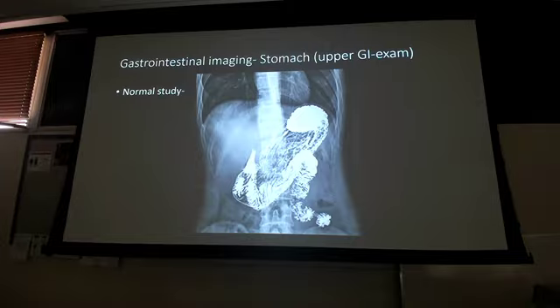But if you think about the way the stomach sits, these patients are lying supine, and the stomach kind of sits back, so the fundus is more posterior than the main body of your stomach. So when you have that barium in there, it will pool down into the fundus. That's actually normal to have a little bit of pooling here, and some pooling sitting in the pyloric area when it goes around. Why? Because that's where the pyloric sphincter is before it goes into the small intestine, so it has to wait for it to open up. But the rest of this is all just your normal rugae.